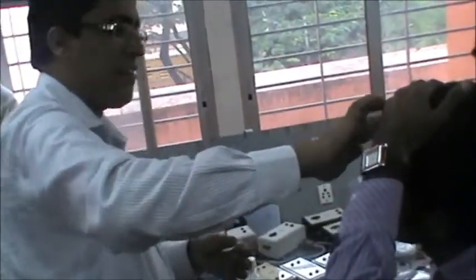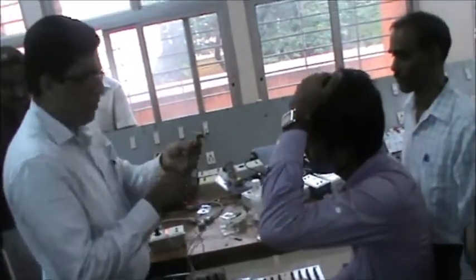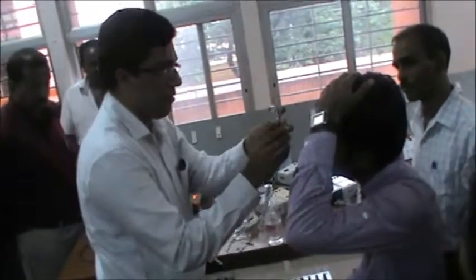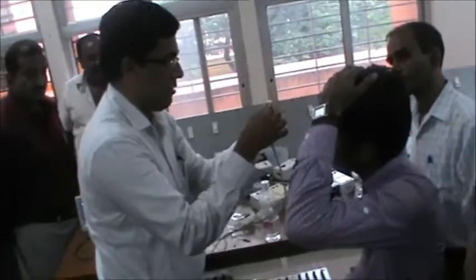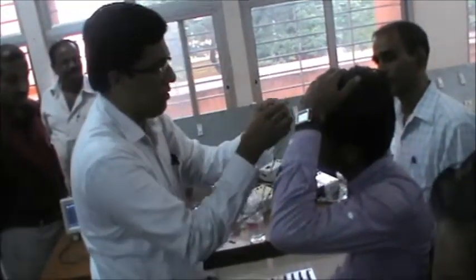Working with biosignals is very interesting. Basically, 16 channels, 10-20. We have different numbers of channels. Reference.